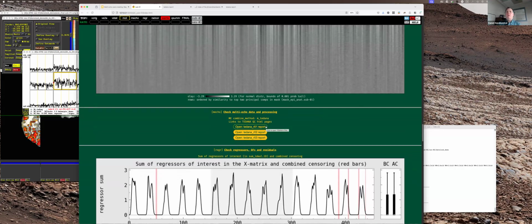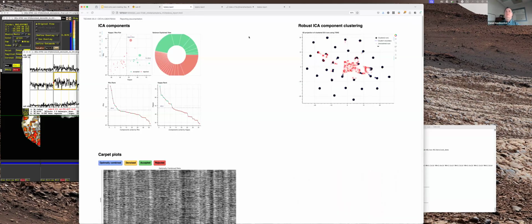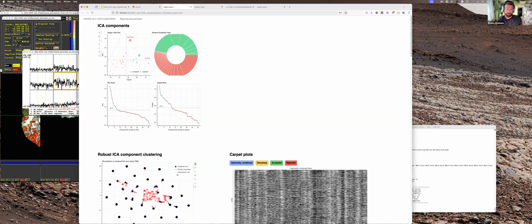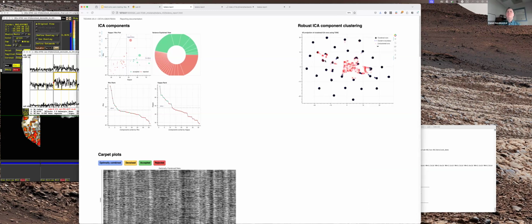And now I will open it. Tedana has its own QC report, so you can just click on this and open the QC report right there. Ooh, that's weird. I don't know why it's appearing up there. Maybe it's just the width of the window. Yeah, okay, it's definitely the width.